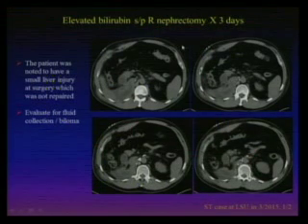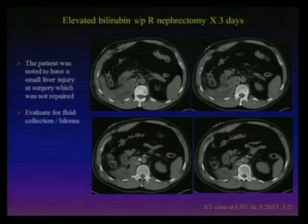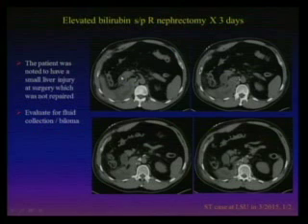Okay, Daniel, new case. The patient had surgery, a nephrectomy, and during surgery they saw some liver injury, a small injury they did not repair. After surgery they did a CT scan to rule out biloma or bile leak. I've got 4 axial cuts. The level is at the kidney. Right kidney, they did a right nephrectomy. Non-contrast. Is there anything you're suspicious of?